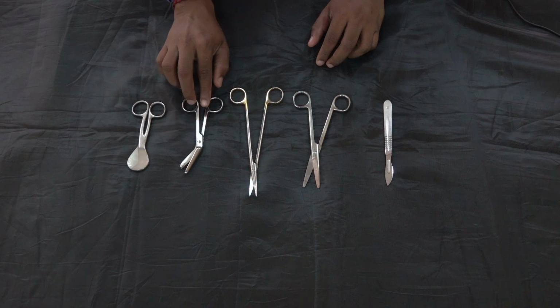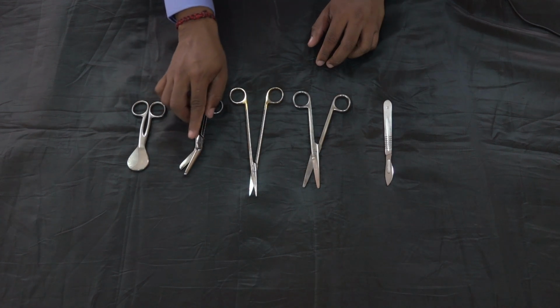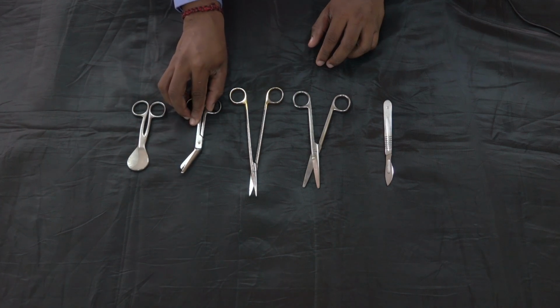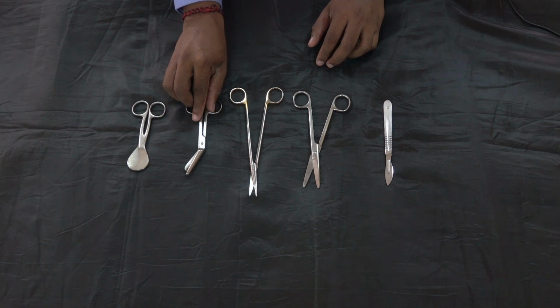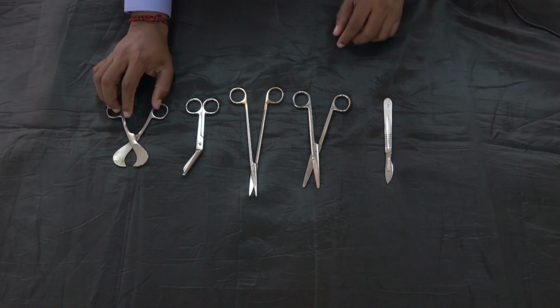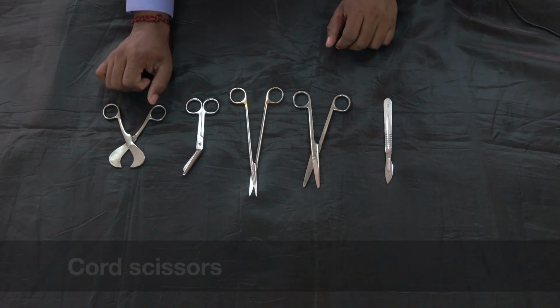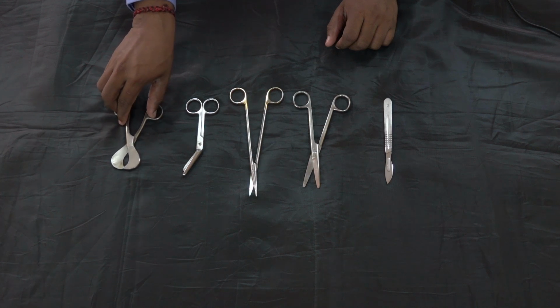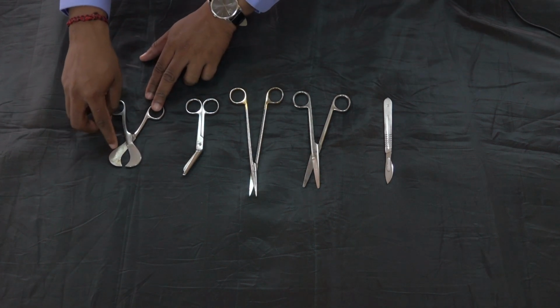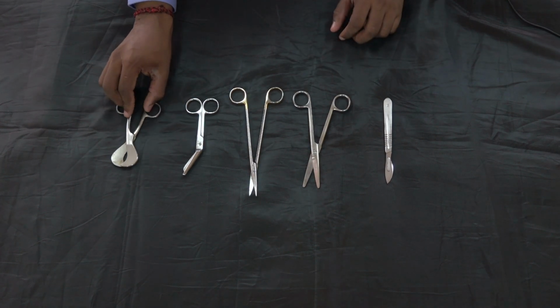It has a straight shaft which is also specially designed and curved because it is helpful to cut the perineum and avoid damage to the anal sphincters. This is another type of scissors used in obstetrics called cord scissors, which is usually used to cut the cord after the baby is delivered, and is specially designed not to traumatize the baby or cord part.